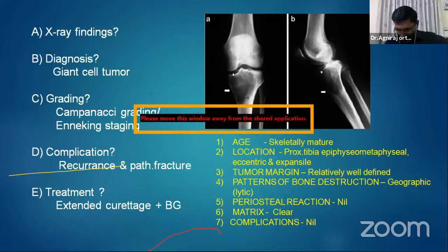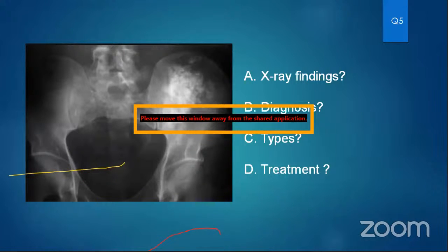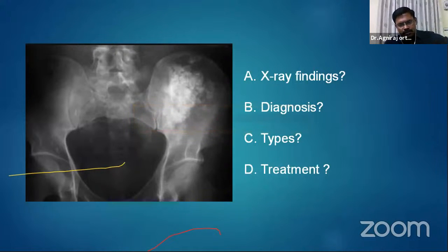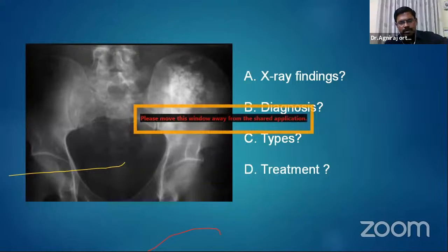Okay, sir. So next we will call Uday Kumar. A simple diagnosis. Good evening, sir. This is a plain X-ray of a skeletally mature individual, an X-ray pelvis AP view, sir. The location of the tumor is on the left ilium bone. It seems to be a sclerotic tumor, sir. The tumor margins are ill-defined. The matrix seems to have multiple ossifications present. So what type of matrix, osteoid or chondroid? The matrix seems to be a flocculent chondroid type of matrix, sir. Very good. Flocculent.